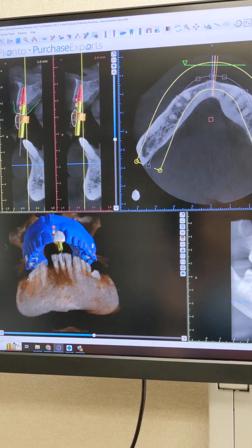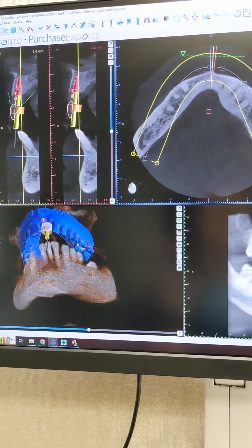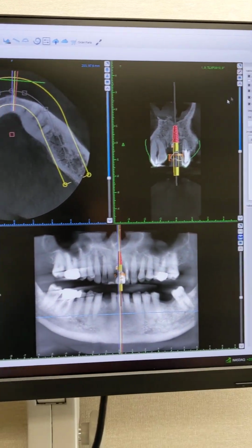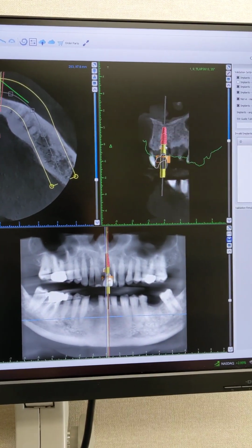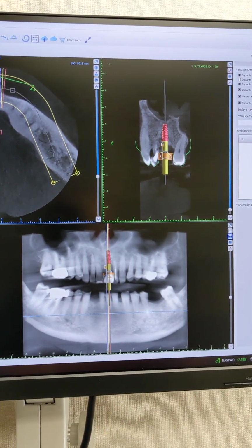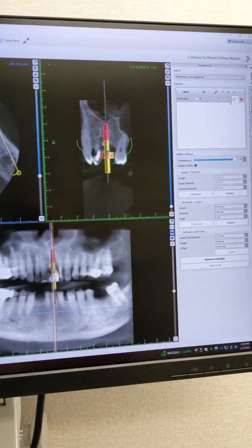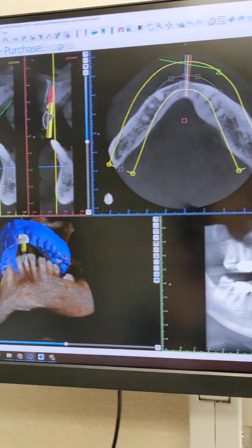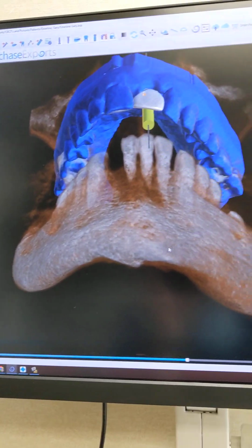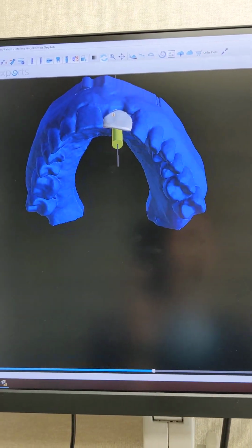Okay, so then I have this. All right, so I'm left with this little guy here. I have the validation because it always gives me the drill validation until... all right, see, look, here it is. Great, awesome, cool, yeah. And then I'm gonna go to my implant list. I'm gonna remove this just for funsies to show you guys. Okay, so then I went here. I did this. I'm gonna hide my rendering. Cool.